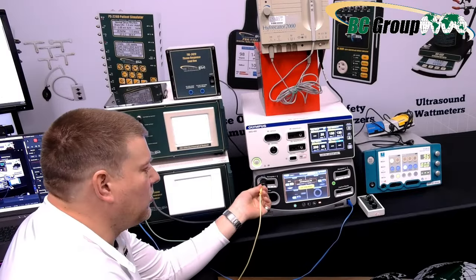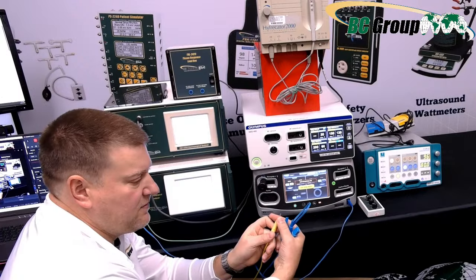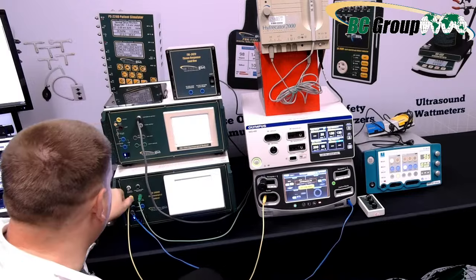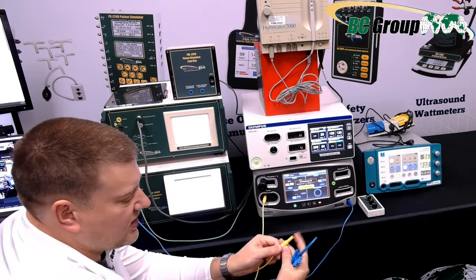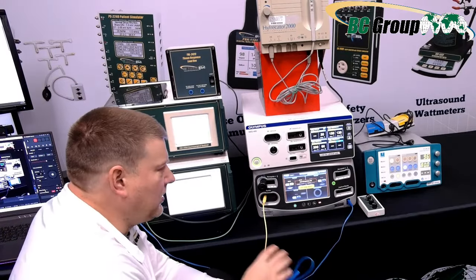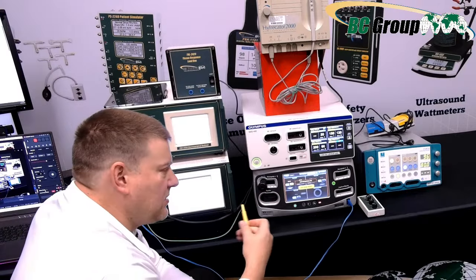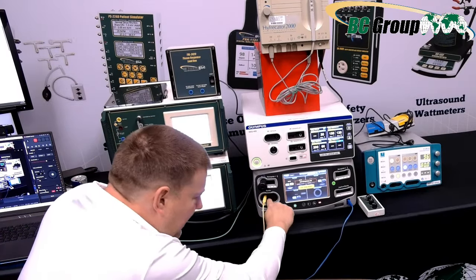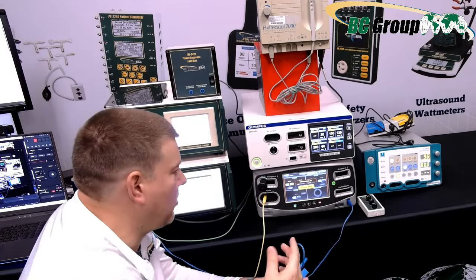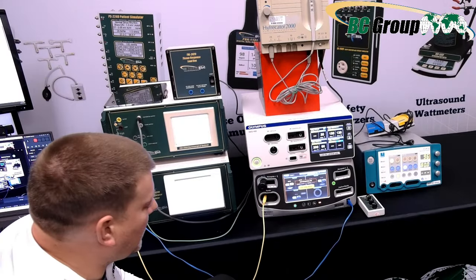For bipolar, standard on most units, we use these banana plugs that have the sleeve that protects you. There are different ones. Some of them have non-retracting sleeves, like this guy right here. It doesn't work. The other important thing to notice for bipolar is almost all bipolars have some sort of micro switches that signify when something's connected. So when you push it in, it has to hit that little micro switch. In other words, it thinks nothing's connected, and it won't output or activate bipolar. So we're in demo mode right now, which allows us to do a lot of cool stuff.